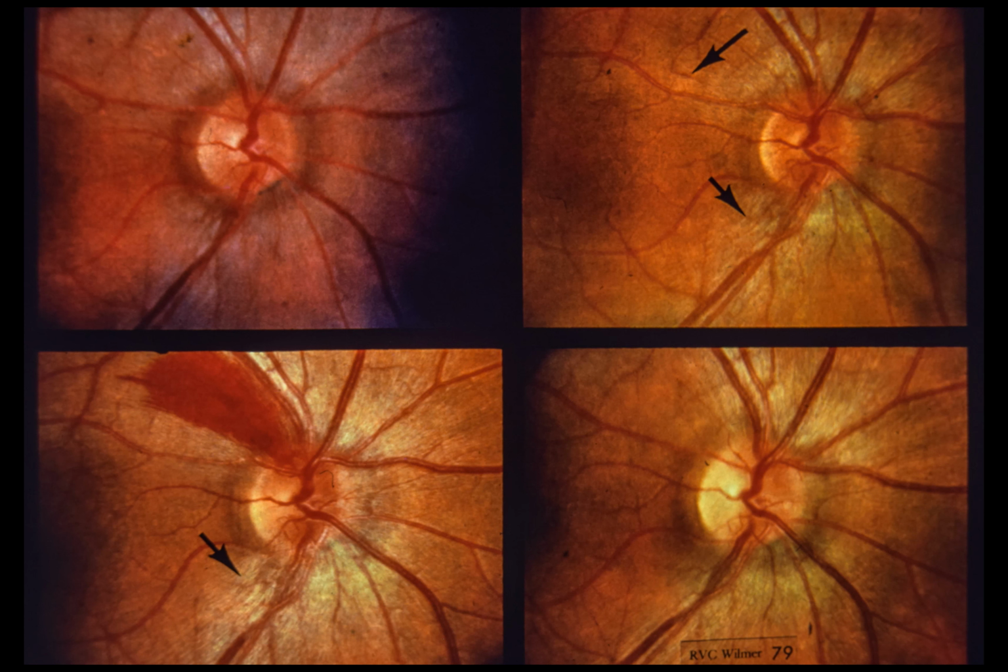Involvement of the optic disc ranges from true optic disc edema, often with superficial hemorrhages, to progressive optic atrophy. Recently, at least one form of the disease has been recognized in its acute stage by the appearance of peripapillary telangiectatic vessels associated with a pseudoedema of the optic disc. A fluorescein angiogram in such cases demonstrates no leakage from the disc or from the telangiectatic vessels. The next slide emphasizes the findings in the acute phase in Leber's optic neuropathy.